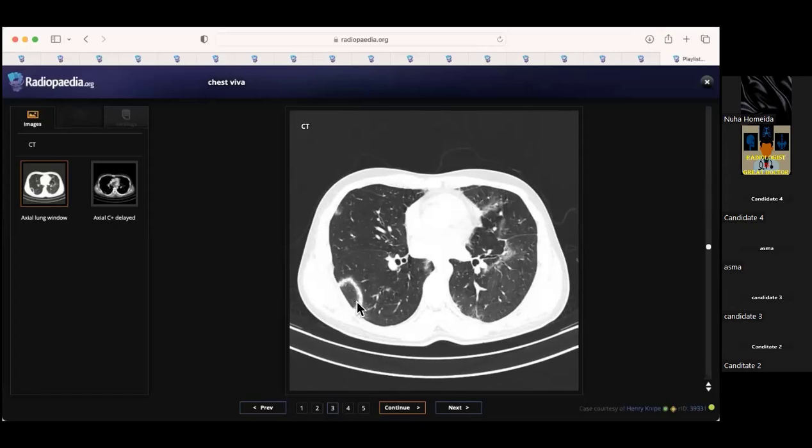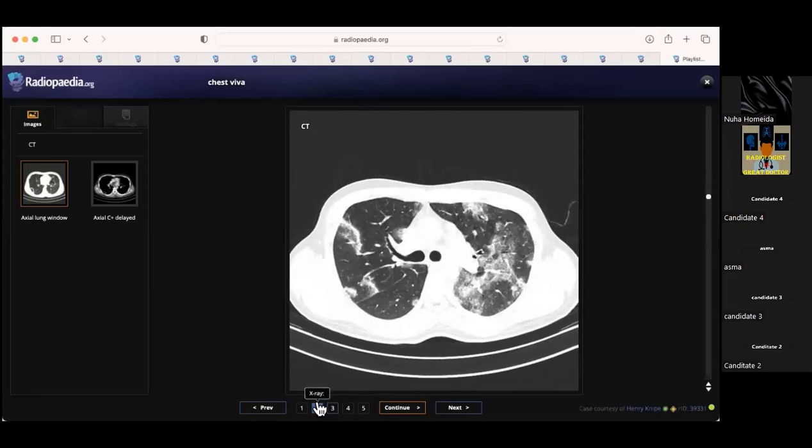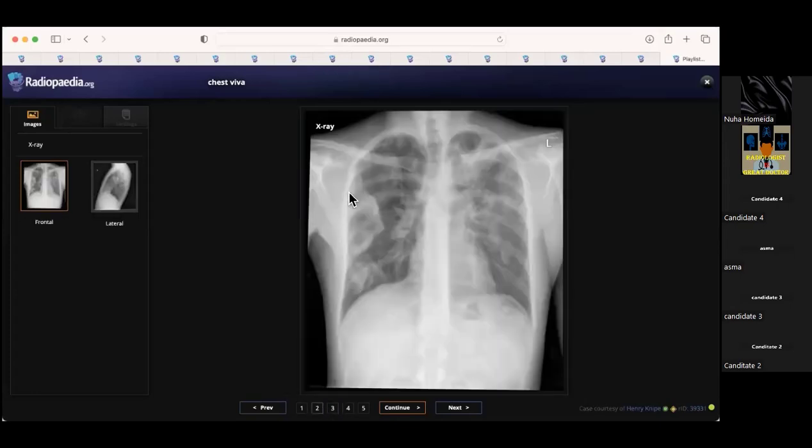So what would you think of? And if I tell you that the patient has a really high peripheral eosinophil count, marked eosinophilia in the alveolar lavage, what would you think of? Eosinophilic pneumonia. Yes, so it's chronic eosinophilic pneumonia. So this is a case of chronic eosinophilic pneumonia. It's a bit difficult, but the distribution.